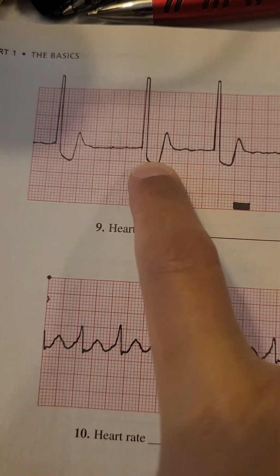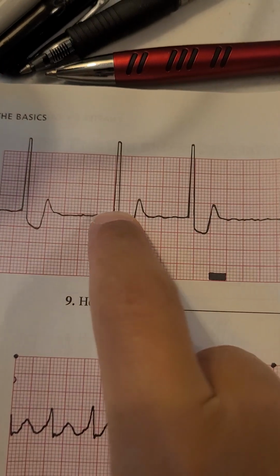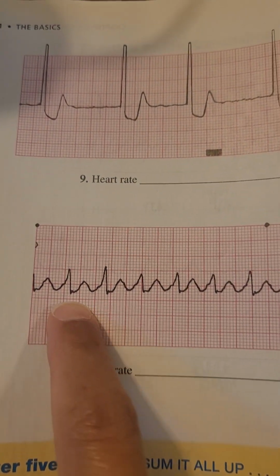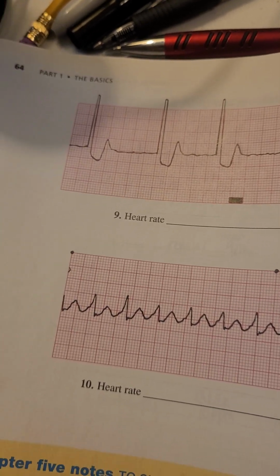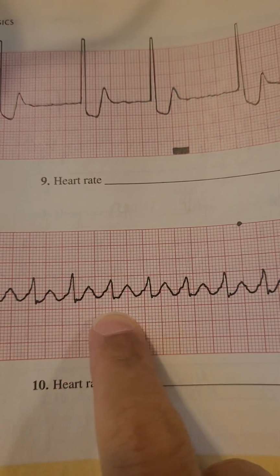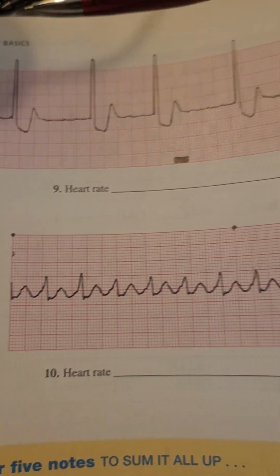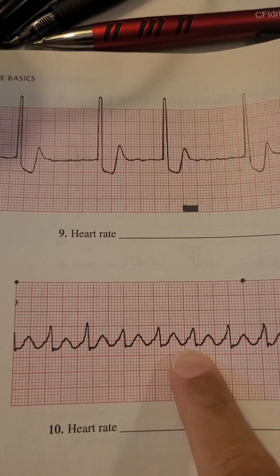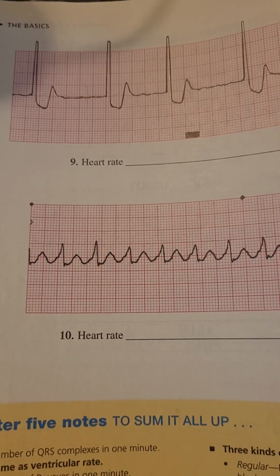You're supposed to make sure of the QRS. Remember, like I said, always look at the P wave to the QRS, and you got to measure the QRS too. If the QRS is greater than, what do we say, 0.12, then we're going to call it something else. Like some of these, it still takes me a minute to this day to decide what I want to call this. Because there's different rhythms, and you'll see later on why.